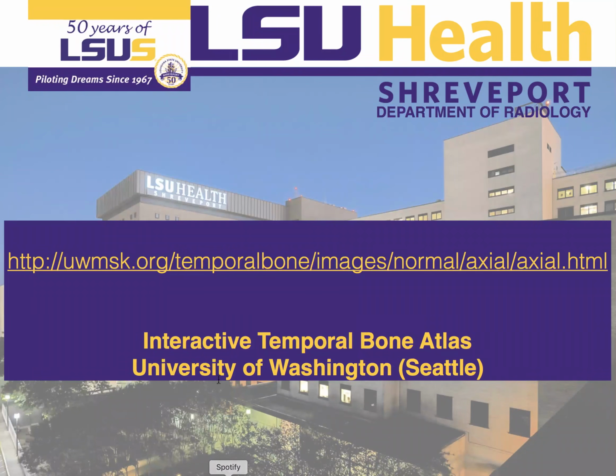So before we finish, I'd like to make this interaction with you, like reading a temporal bone. And here is the interactive temporal bone atlas that the University of Washington made. So let's go there. This is the axial view. Let's point.